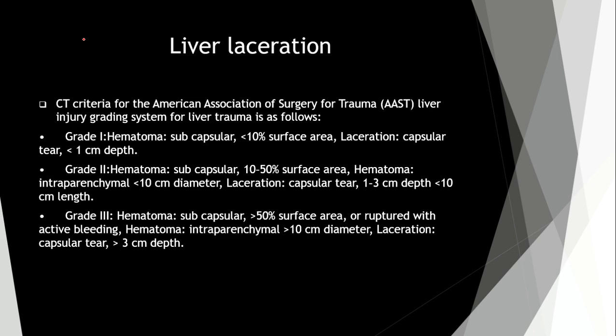I try to show you some emergency situations, because if you have a liver laceration or spleen laceration, you must act immediately. You don't have any time to wait for a radiologist or anybody. You must read the CT scan by yourself.